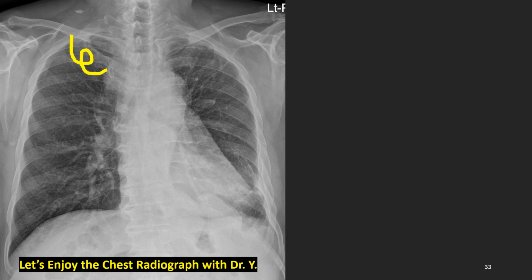How about this patient? Let's forget this right part tracheal bulging. Just forget it. What do we see? Yes, you got it. This one. His descending aorta is very tortuous, so this may interrupt or masquerade the tumor mass here. But this is tumor, not tortuous descending aorta.